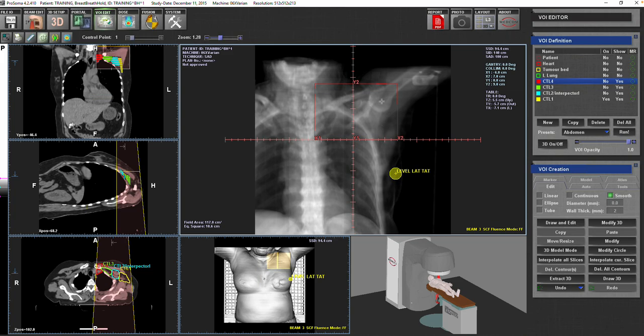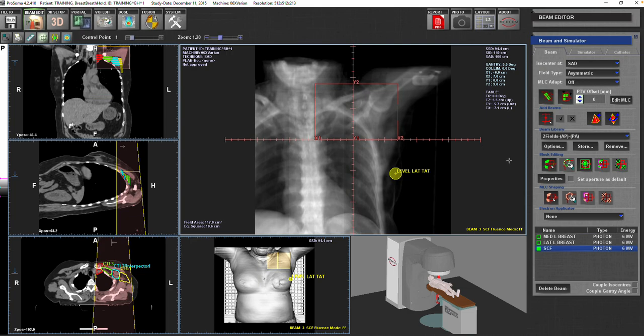CTL2, where your border will be, and again here will come the coracoid process. I don't know if I said cricoid in the previous lecture, so please forgive me if this was the case. So the coracoid process, you can see it here, you can see its projection, which is basically why some of the books would say it's medial to the head of the humerus.